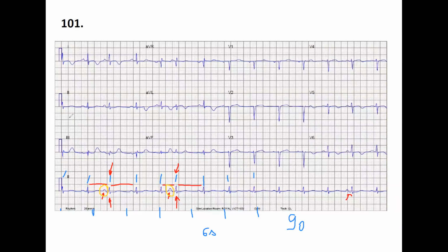Now we figured that out. The next thing left is the axis. So far we do not know anything about the duration of the P, the PR, the duration of the QRS, the QT interval, the T wave, and so on. But so far nothing.